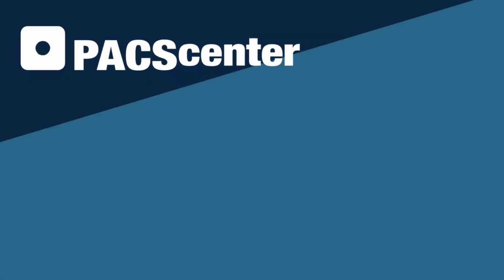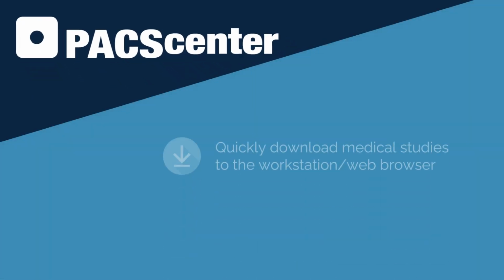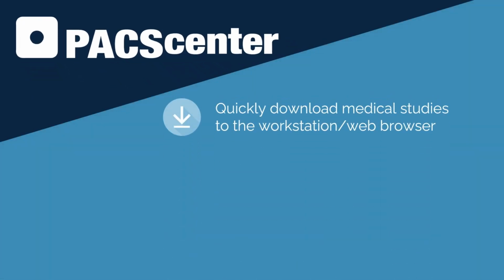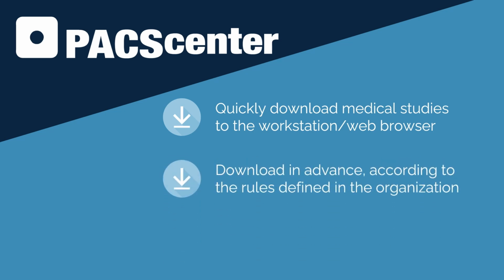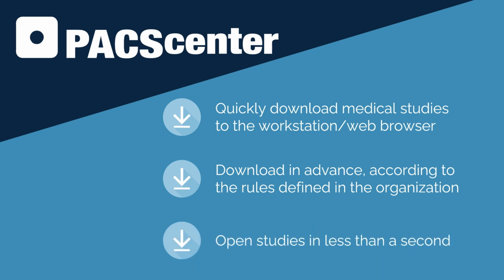Using PACScenter, you can use the prefetch mechanism in order to quickly download medical studies to the workstation. This mechanism causes workstations to download medical exams in advance, according to the rules defined in the organization, such as by modality or study history, and it allows studies to open in less than a second, saving time.